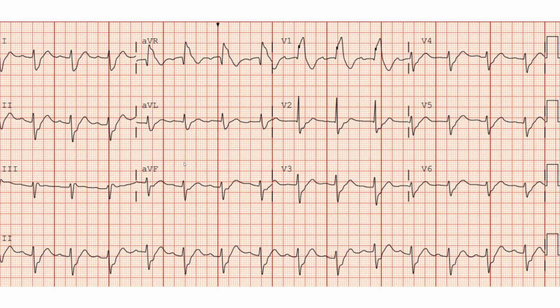Again, there's many abnormalities on here, which I find interesting. Let's go through them. Number 1, same thing, we have a complete right bundle branch block. And if you look at it, the morphology of the right bundle is odd appearing, right? We don't have the classic RR prime. And the ST depression here, again, looks odd. Now, remember, in a right bundle branch block, ST depression or T-wave inversion in the anterior leads is normal, okay?